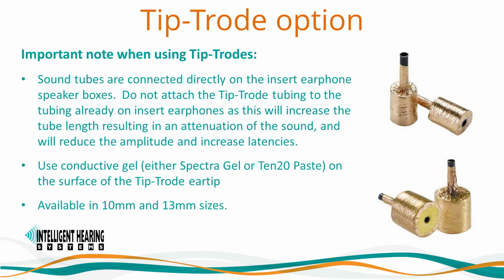It is important again to note that when using Tip-trodes, sound tubes need to be connected directly to the insert earphone speaker boxes. Do not attach the Tip-trode tubing to the tubing already on the insert earphones, as this will increase the tube length, leading to an attenuation of sound and will reduce the amplitude of the response, as well as increase your latencies.